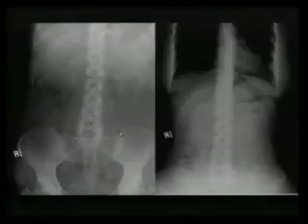Then I go sacrum, look at the SI joints, look for sacroiliitis, look at the arcuate lines, make sure there's no fracture, make sure there is a coccyx, a lower sacrum and a coccyx. I look at the iliopectineal line, make sure there's no interruption in that, no fractures. I go around the iliac wings. I look at the greater trochanter. I look at the femoral heads, look for AVN, look for developmental dysplasia of the hips, look for bad degenerative changes or whatever. Then I go real quick, look at the ribs.